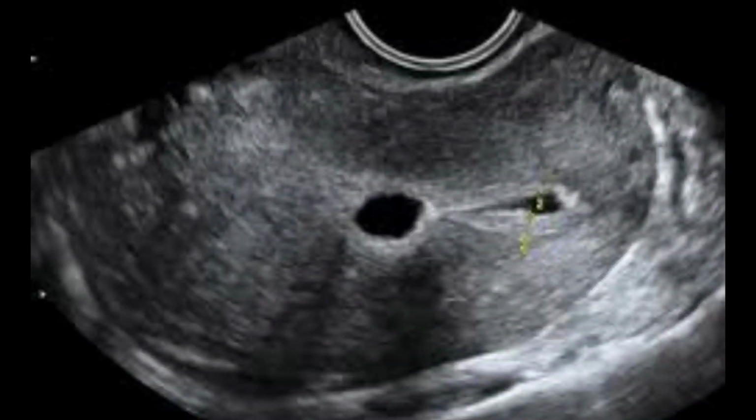So instead of jumping to the disease process, always look for the physiological process. If there is a physiological process, that's fair enough, mention in the report small fluid within the endometrial cavity, most likely due to physiological process because the patient is in menstrual phase. But if there is no menstrual phase and there is small fluid still within the uterine cavity, this would be considered as PID.